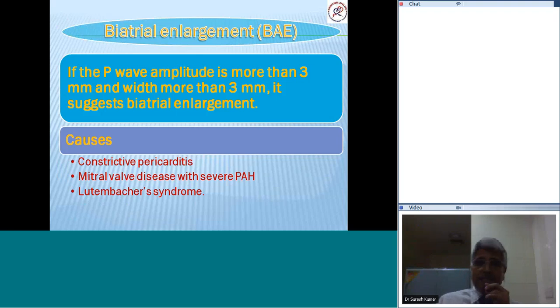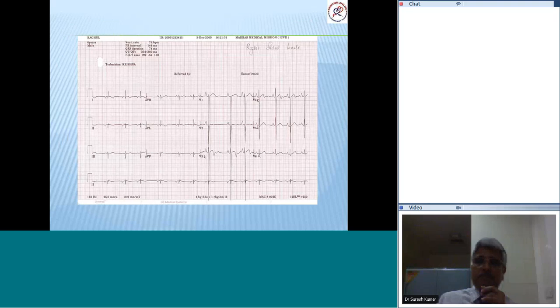So there is some digression to theory because none of you answered the question. We will go back to showing you ECGs. Look at this. Do give me a response. We have moved away from atrial enlargement. No responses? Vikas, tell me what it is.